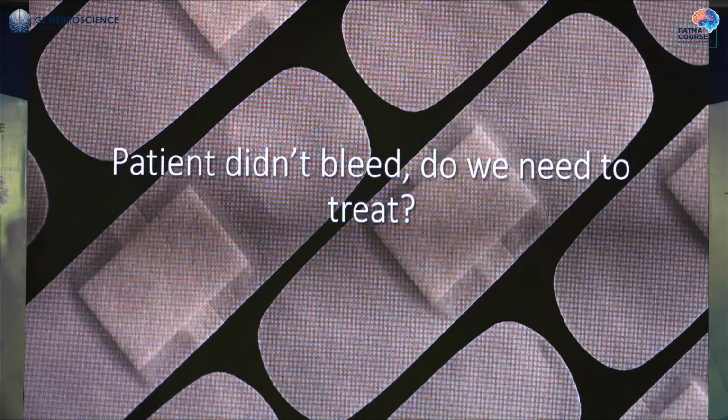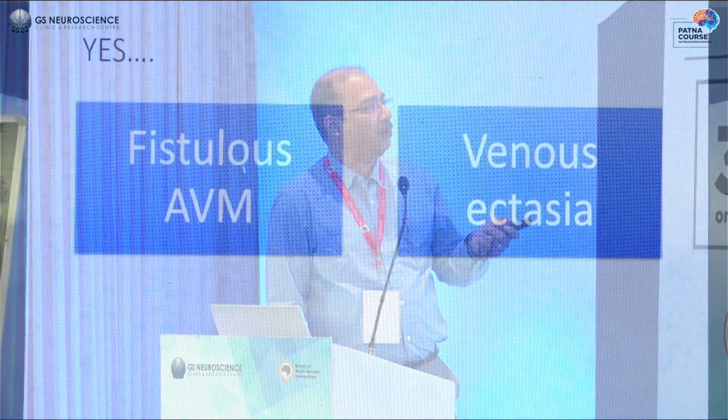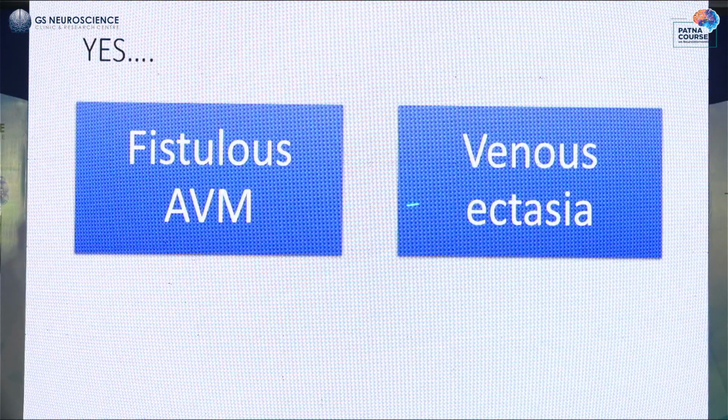So now the important question comes: the patient has not bled, he is a 12-year-old, preserved. Do we need to treat? So, having known that this is a fistulous AVM with a venous ectasia, possibly yes.